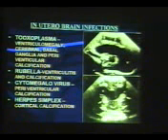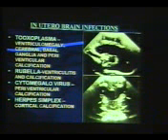Then we can see the infections in utero. What we are seeing: toxoplasma, ventriculomegaly, basal ganglia and periventricular calcification. This is the periventricular calcification we are seeing here with hydrocephalus, and this is the basal ganglia calcification with hydrocephalus. This is due to in utero infection, the toxoplasma, rubella, or TORCH infection, including cytomegalovirus.